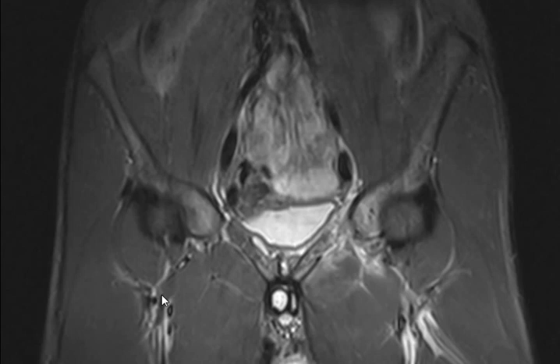Sorry? The T2 fat-saturated, yeah, we have it. What would it do for you? It would be high signal in both. So you don't want to ask the patient if he does any repetitive exercise or whatever to confirm that he might have a stress fracture? I told you he's a muscular guy, maybe athletic.